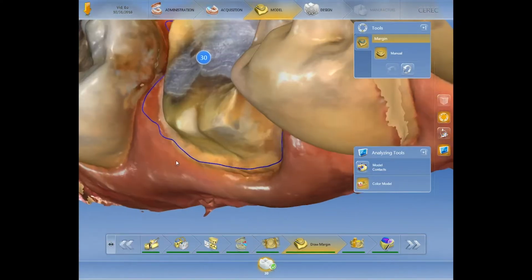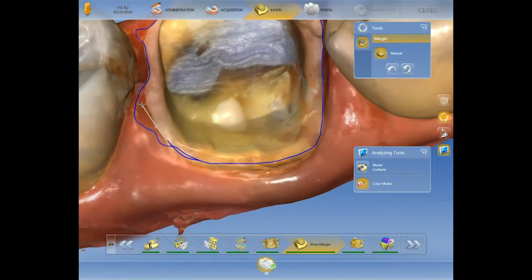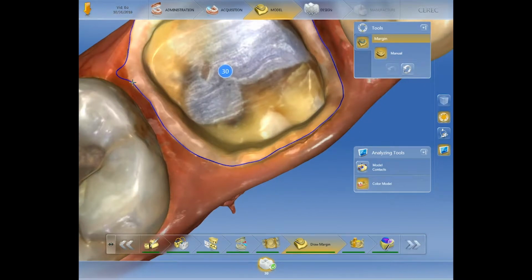You're going to also have to get used to rotating and moving your model as you work so that you can see it in different angles. As you get to the end here, while continuing to manipulate and look in different planes, you're going to want to take an overall step back and make sure there wasn't any area you missed that stepped off the margin.